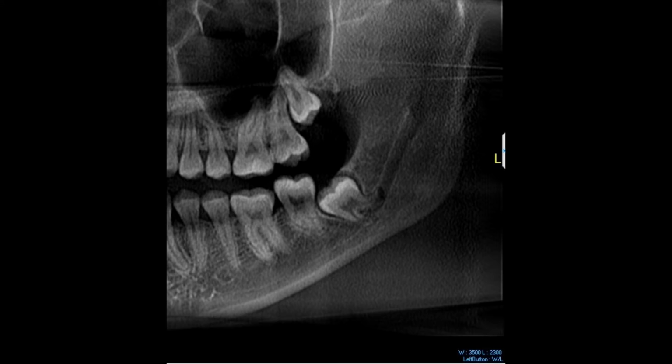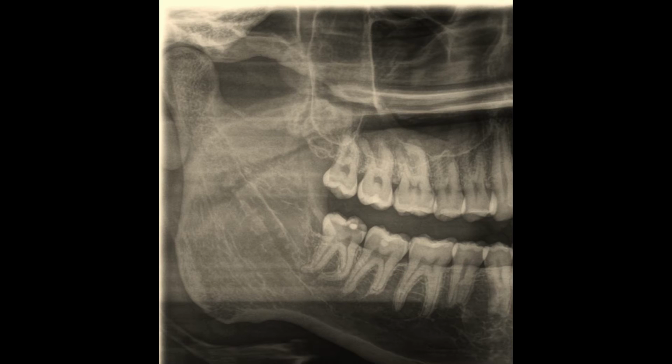This image that I'm bringing up represents something a little different. Now you can see, going back through our list, disrupted superior cortical border, deflected roots, and here you can see how the root tips narrow. Now they're deflected, but they also narrow at the superior border of the canal. So narrowing of the roots is another thing.